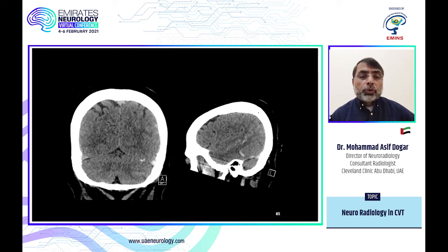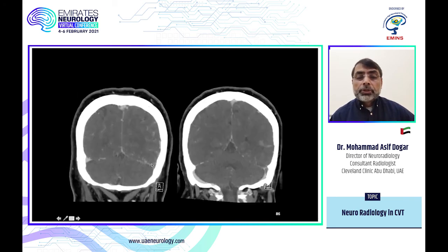So this is our friendly coronal image. So compare it here. So here is even the parenchymal hemorrhage. So this vein is hyperdense as compared to the superior sagittal sinus, as compared to the right transverse sinus. So the left transverse sinus is hyperdense. We can even see on the parasagittal image. Now you do the CTV, and you can clearly see there's a filling defect in this transverse sinus.